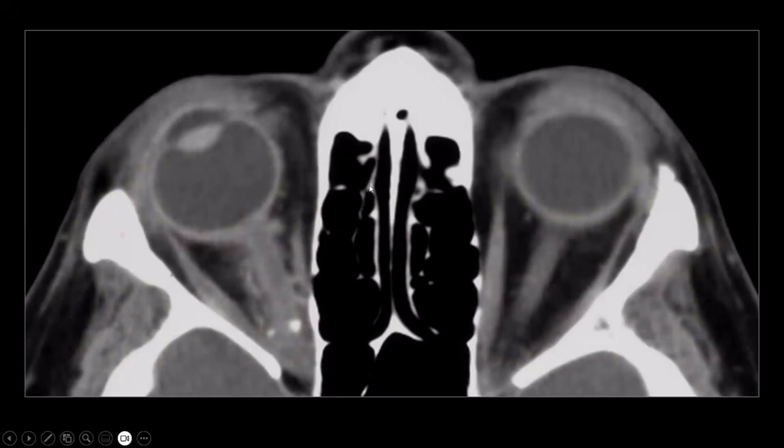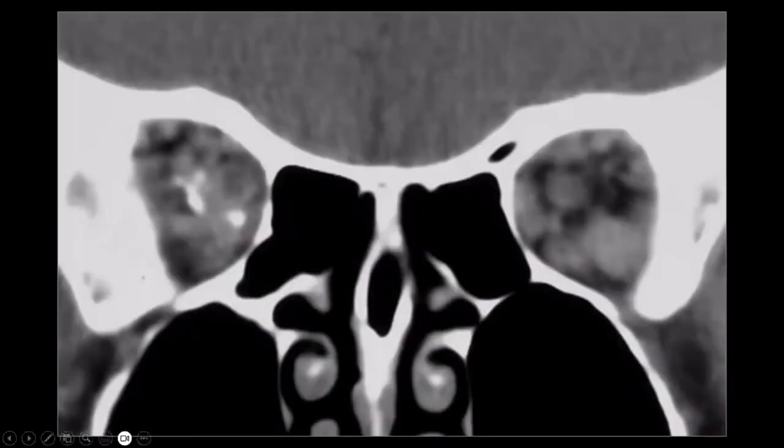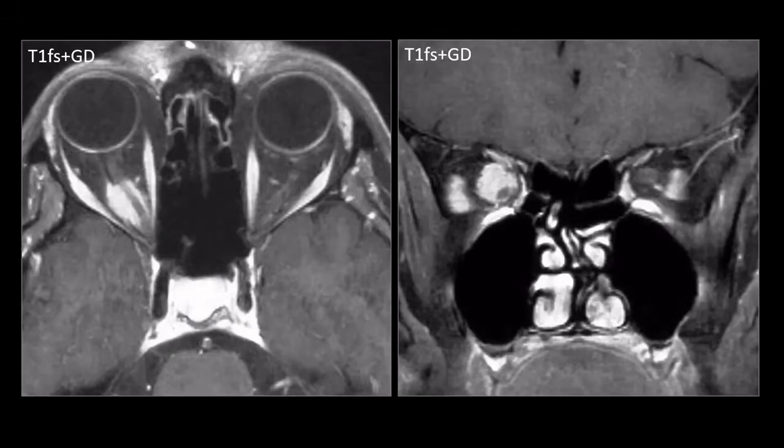This is a first example. This was a patient with monocular visual disturbances. If we look at this CT image, we see some calcifications located along the optic nerve, and the fatty tissue surrounding the optic nerve seems to be infiltrated, or it's all a bit blurry and hazy over here. So what is this? This is the coronal image, and over here we have the optic nerve, and then we have this sheet of tissue which seems to surround the optic nerve and contains a lot of small spiculated calcifications. Now the calcifications are a giveaway in this patient. This was an optic nerve meningioma.